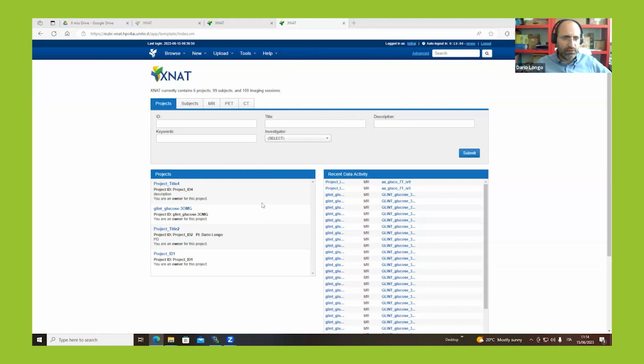If you want to allow other people to work, you can simply add them as collaborators, and then they will be able to look at the images. And if you have people who need to perform some annotation, some region of interest drawing and so on, they can easily do it.